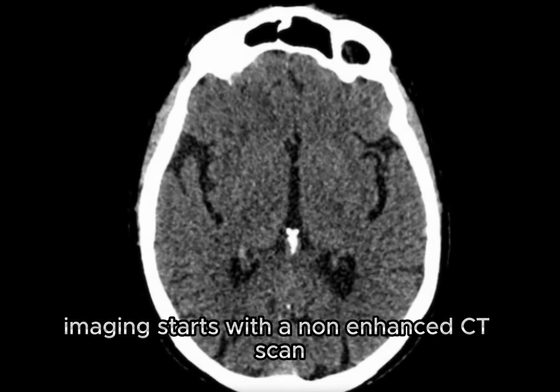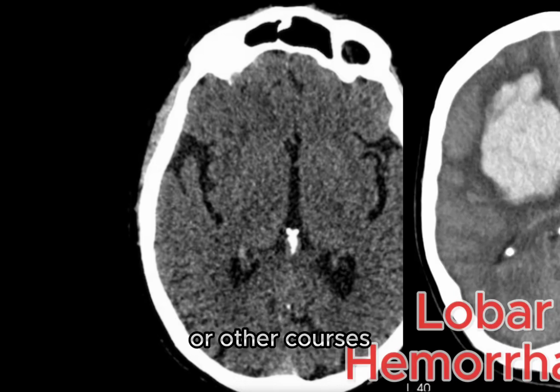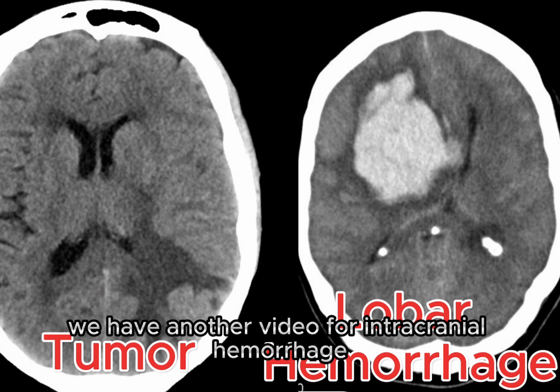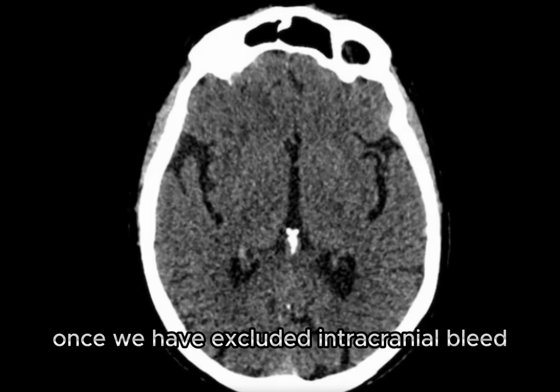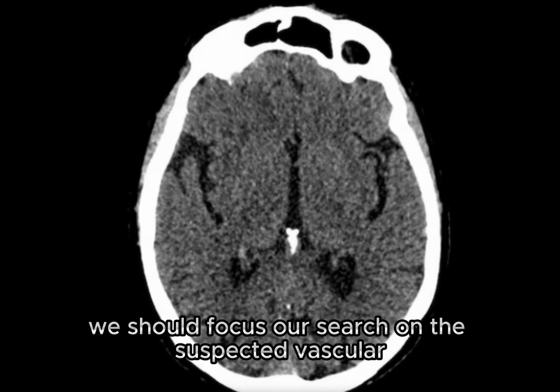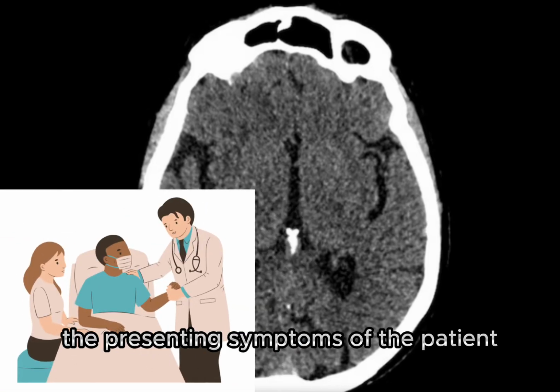Imaging starts with a non-enhanced CT scan, and it's important to rule out intracranial hemorrhage or other causes. We have another video for intracranial hemorrhage if you want to check that out. Once we have excluded intracranial bleed, we should focus our search on the suspected vascular territory, given that we are provided with the presenting symptoms of the patient.